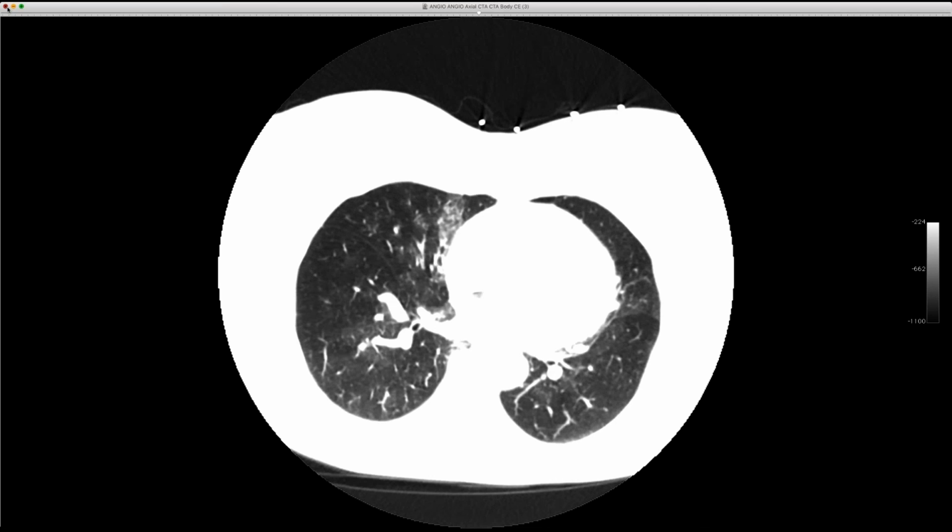Yeah, it's interesting. There's still a lot of controversy about CTEPH, what actually happens, and some people think the microvascular disease in the lung is part of the condition, and sometimes that dominates the clinical picture rather than the central clots that we typically look for. So I think what we don't know about that entity exceeds what we know about it. That's a very interesting picture that you showed. Yeah, it was impressive, the discordance in the CT, but it correlates with the mosaic attenuation.